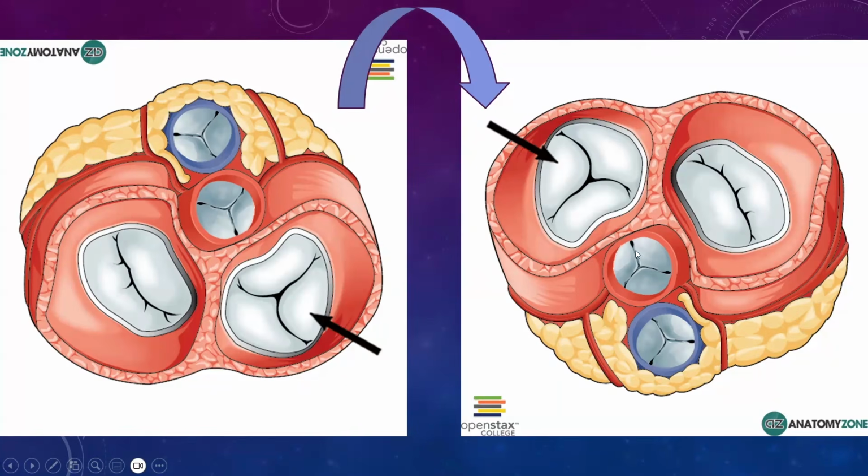you have the aortic valve here at kind of 5 to 6 o'clock. And then that allows more of a view of the tricuspid valve that's in keeping with what you see on some of your echocardiographic views. So more of the typical transgastric orientation.